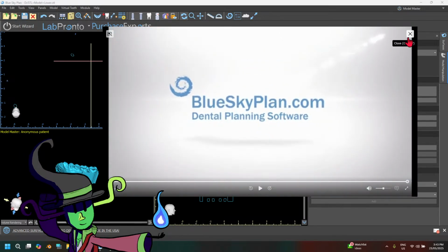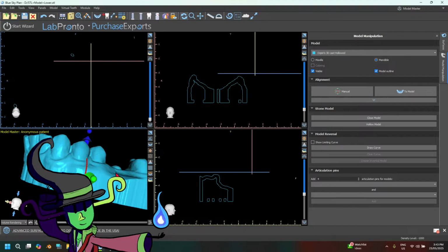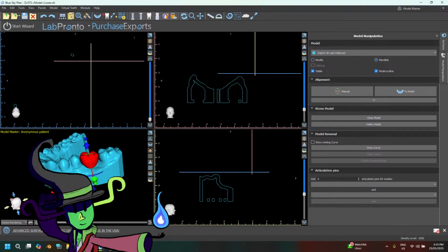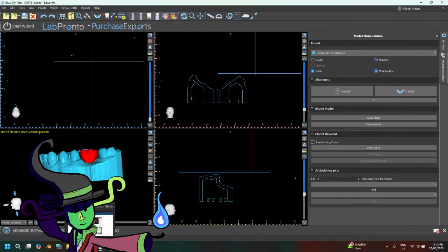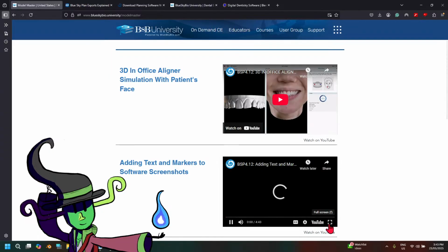Anyway, I guess that's it for. Well, actually no. I want to add a name to this thing, just so I can prove to people that I'm the one who made this. I think this next one will tell me a little bit how to make a name here.